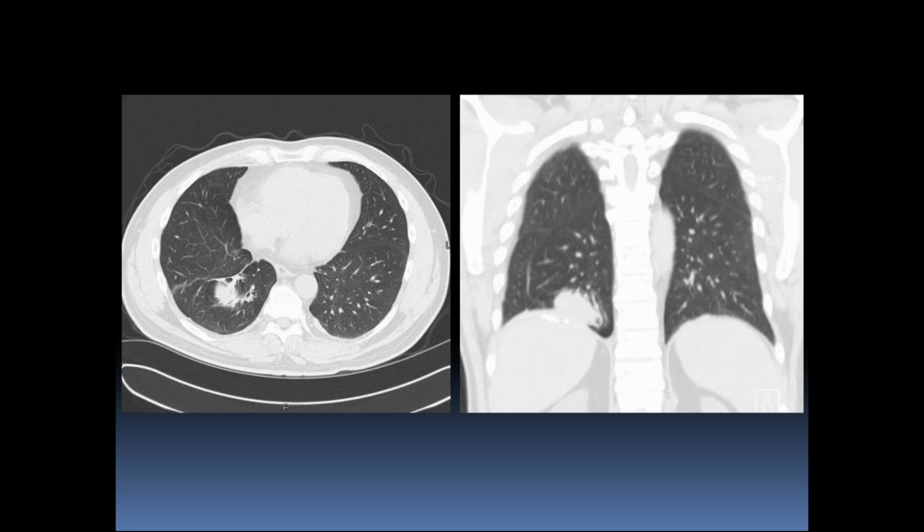It looks like an onion basically in the coronal view. And what is it doing to the major fissure? It's curling around. It's retracting it. You get that swirling pattern of the vessels and of the bronchi. So really nothing looks like it, and I've never really been afraid to say that this is round atelectasis. I don't make people follow up on this. I just say what it is. But at some point maybe you'll get comfortable to do that as well.